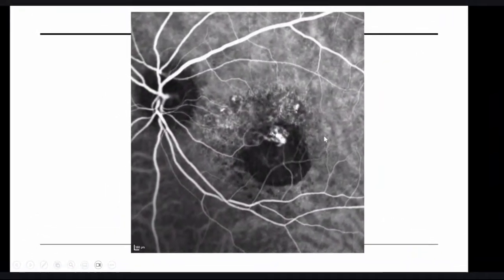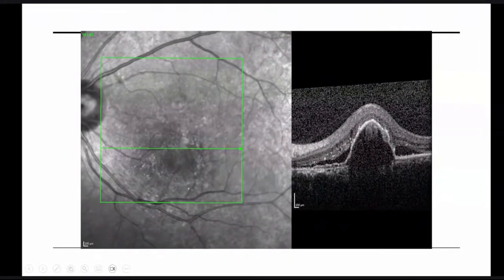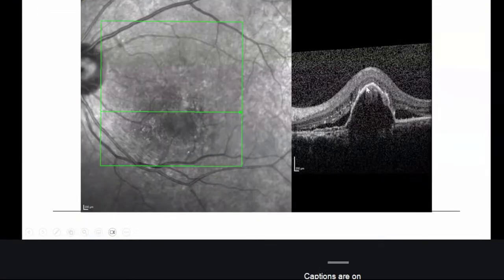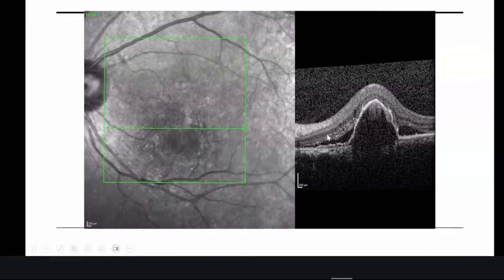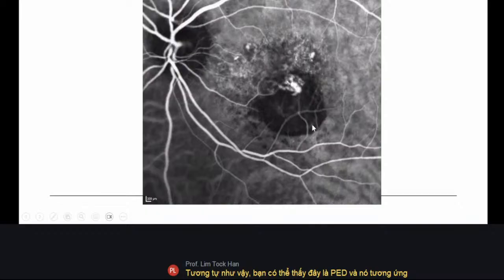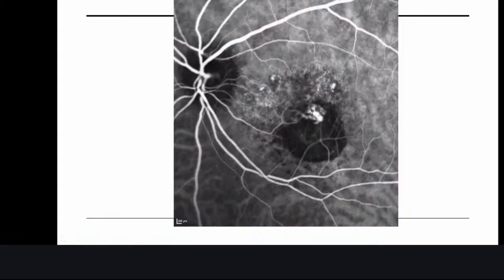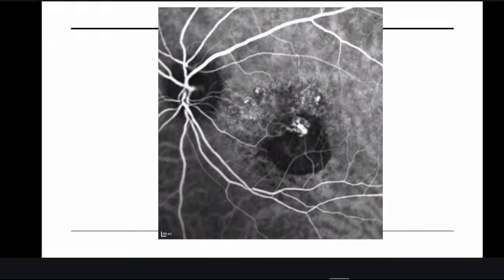And you can correlate with the image you saw earlier, right here. This lesion is actually this lesion right here. So it corroborates your finding from one modality to the other, giving you very clear certainty that you're dealing with a PCV lesion. Likewise, you can see that this is PED right here, and that corresponds to this hyposignal area right here. And a dome-shaped lesion in confocal scanning laser usually appears hypofluorescent due to total internal reflection differences.